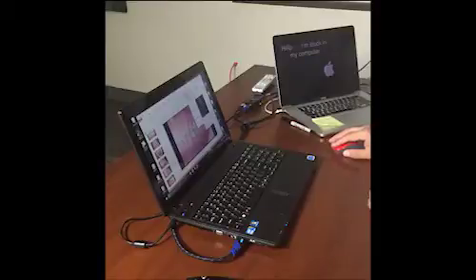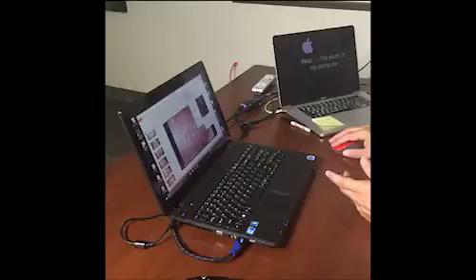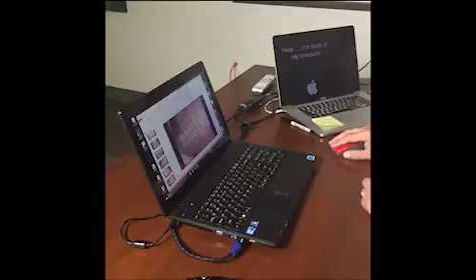I would arrange that, okay? And rotate. Now, why isn't it lighting up? What did I forget to do? I did not select the image. If I select the image, all of a sudden, that horizontally.